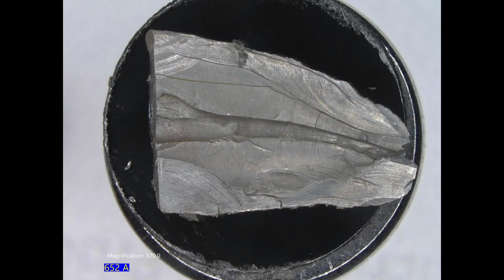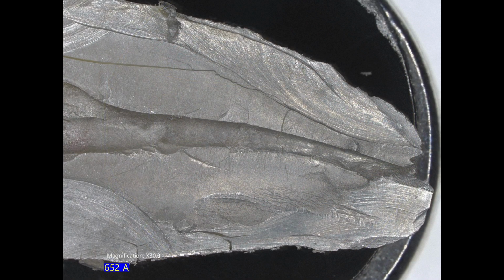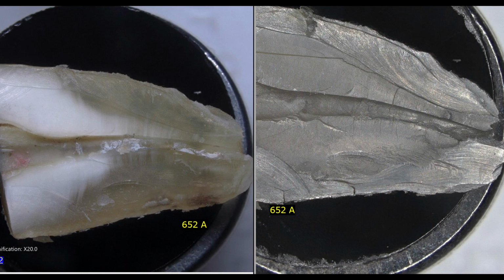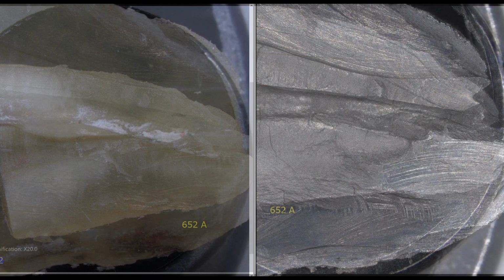And we're going to examine them in several areas. These are what the sputter-coated sections look like, and I urge you to go to the site and try to compare these and correlate both the wet, dry, and sputter-coated sections and see if you can actually detect where we're looking.